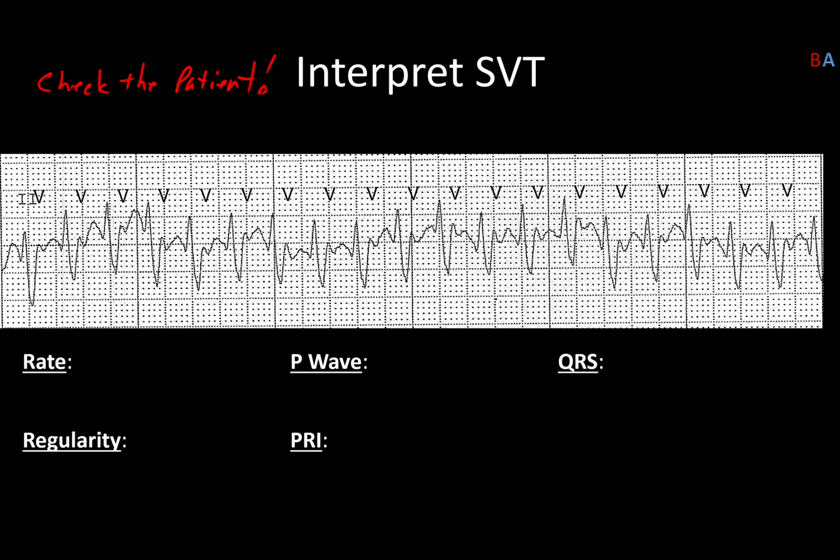Now, this is a 6-second strip. And while you're looking at this, you can tell that it's pretty regular. There's no ectopic beats. They all pretty much look the same. They look pretty ugly, actually. All right.